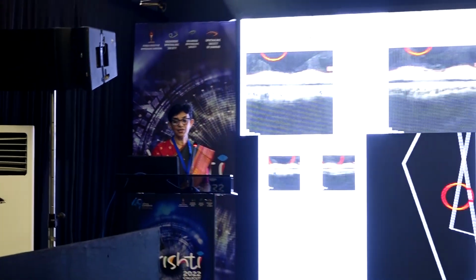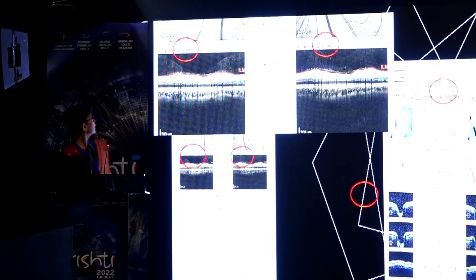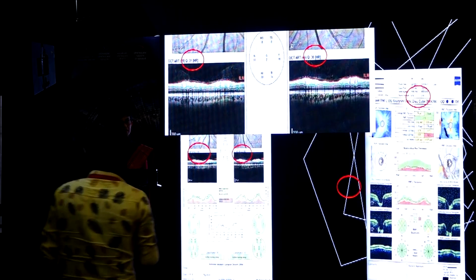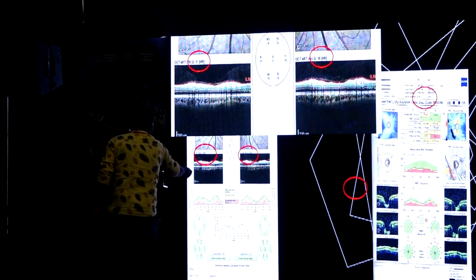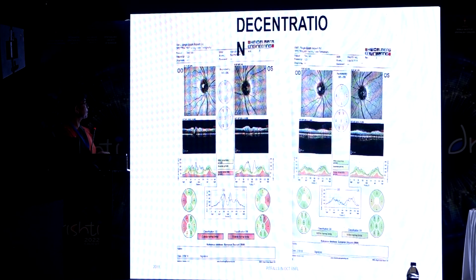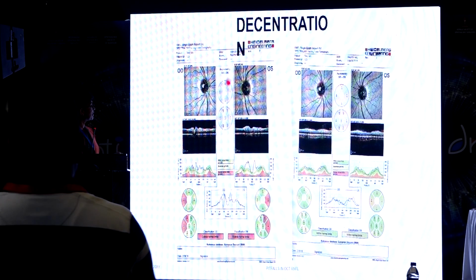This is where the signal strengths are given in the Spectralis, and you can see that it is 31 in the right eye and 30 in the left eye, and that is pretty good for this machine. For the Cirrus, RNFL thickness measurement. Now, in this printout, you can see very clearly that the circle is exaggeratedly decentered.